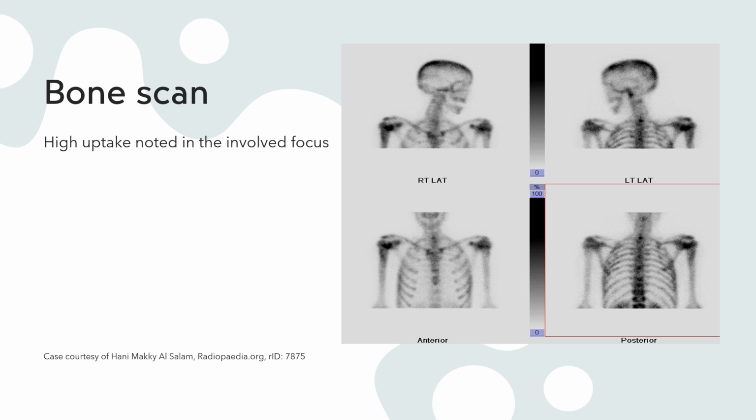Lastly, the patient may go on to have another scan, in this case a bone scan. And the whole principle of a bone scan is that the signal or the radionucleotide usually concentrates and then gives off emission at the tumor focus. So in this case, we have a really high signal coming off from this focus and this side. And on the anterior scan picture, we have it on this side. And this comes off as the right humeral head Ewing sarcoma.